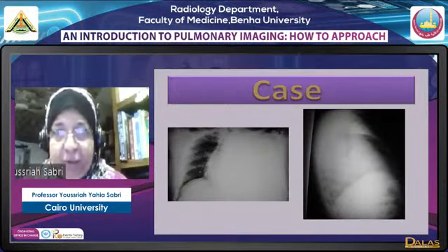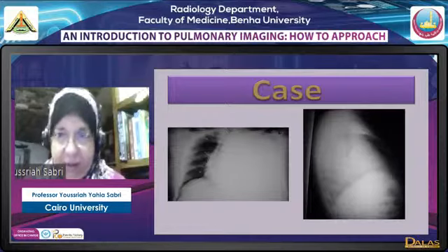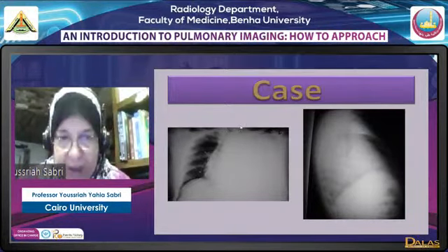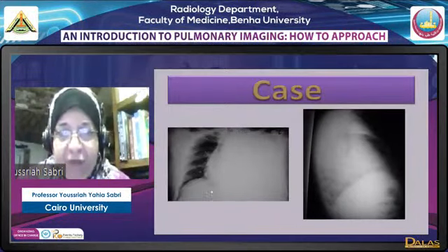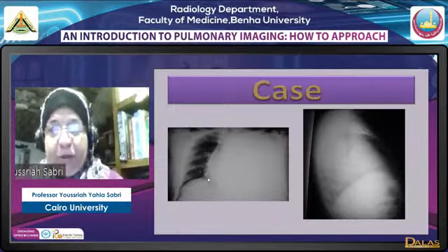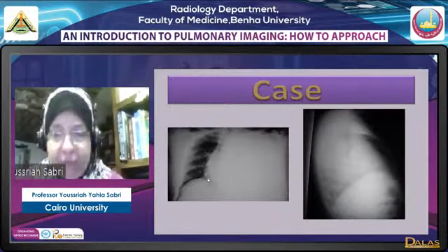The 5th possibility is that we have a hemithorax problem with no volume change, and this has a very limited differential diagnosis. Now, to start with, we have total opacification of left hemithorax with contralateral mediastinal shift, a typical appearance of what? Of a massive effusion.